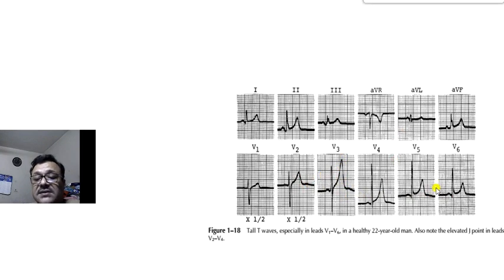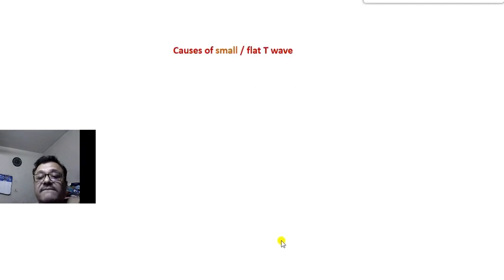Look at this ECG. There is V2, V3, V4, V5. What are we actually normally seeing? V6 is taller than V1. Here is V4 to V5. V4 has a tall T wave. It is normally physiological in African and Asian people.